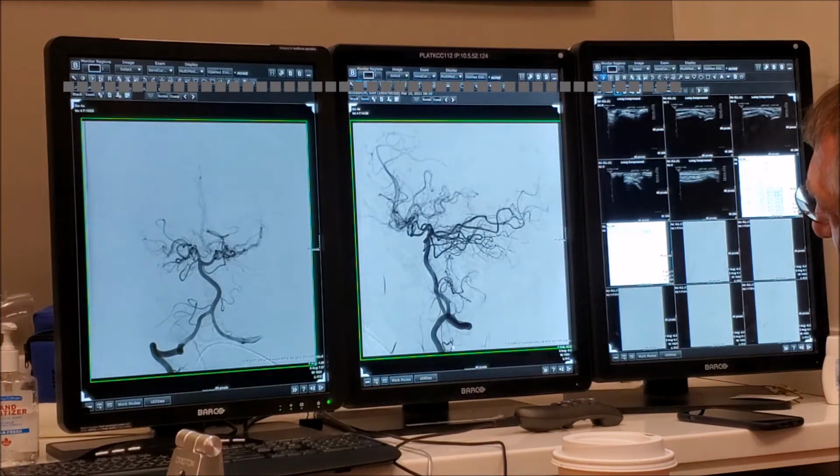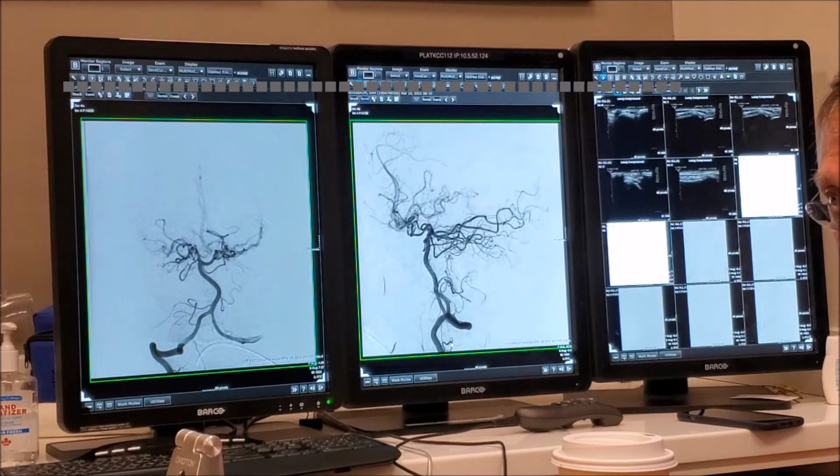Definitely, this is what you call muscular, but in reality it is the occiput. There's the first space, here's C1. Sorry, occiput, C1. This is C2, so it's at the second vertebral body. And what is the importance of that artery? C2 anastomosis, what with what? The occipital artery. Occipital artery with what? With the vertebral. And why is that important? Because when you're doing embolization of the occipital, you don't want to get a posterior fossa stroke, right? So that little bastard can be quite important.